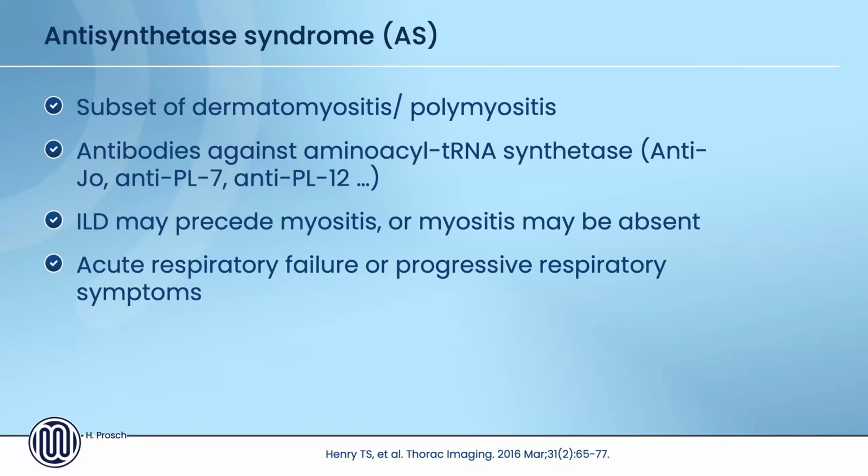Yeah, one thing is, the last question I think is, can you tell between methotrexate-induced pneumonitis and rheumatoid disease, hypersensitivity versus NSIP or organizing pneumonia? So methotrexate-induced lung toxicity usually is an acute hypersensitivity pneumonia. And this is something you can diagnose quite well. Probably we have time for another, when we can meet another time, I have more cases on that as well.